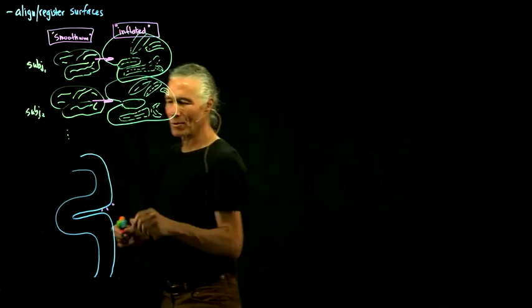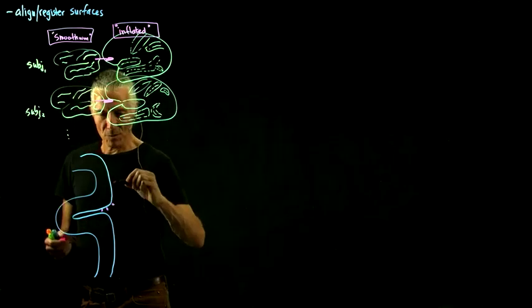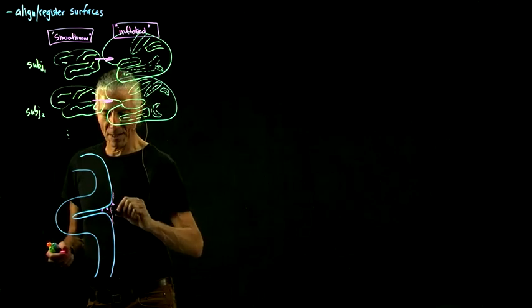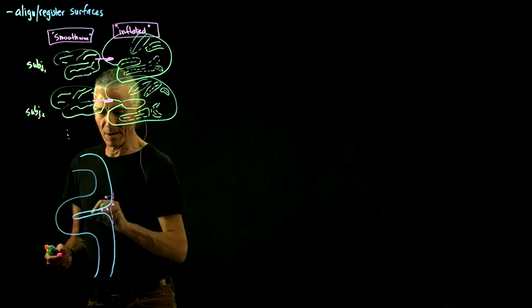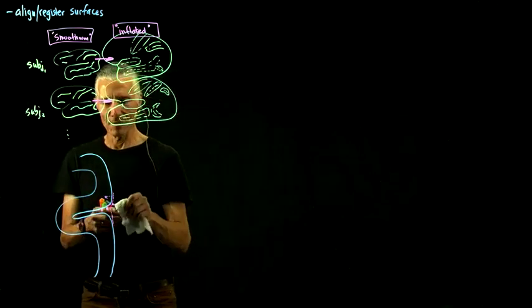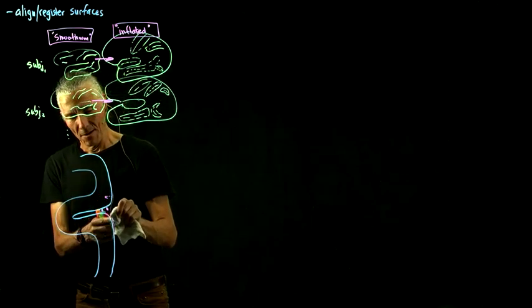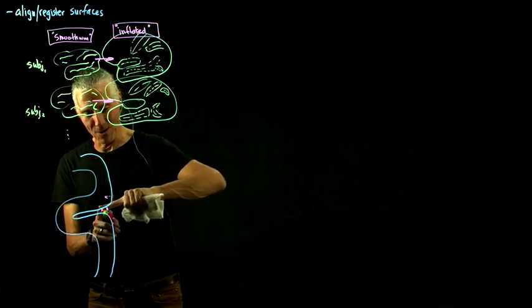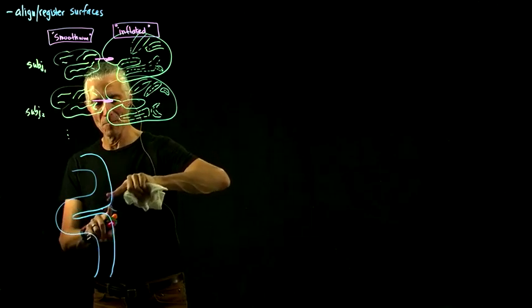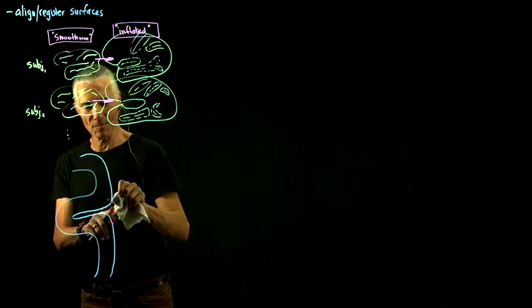So one thing you could do is shrink a surface onto it that was very stiff, and then just try to measure the depth, like measure the depth until you run into the cortex. That might be a sort of complicated way of doing it. Or you could do one line of code, and what that one line of code does is just measure how far the surface moves when you inflate it.